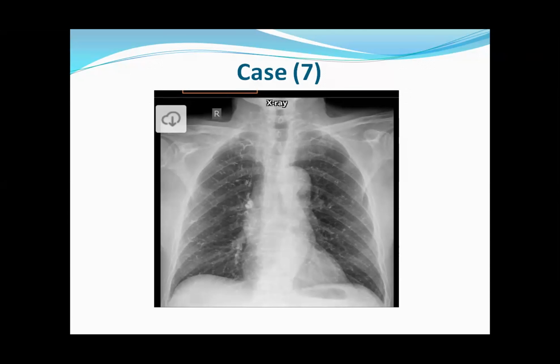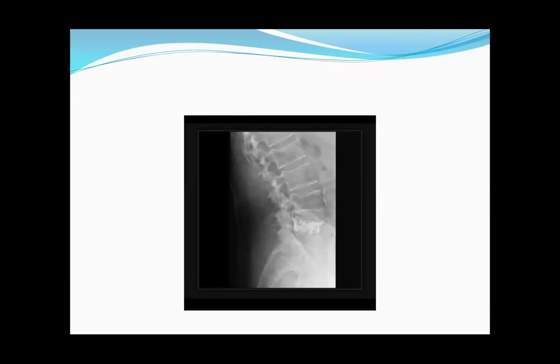This patient would not need any further evaluation, and can be kept under follow-up. Previous vertebroplasty. Yes.